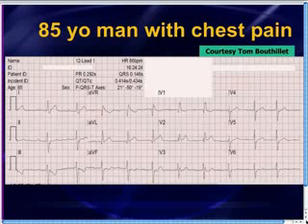Well, there is. Just like last week, there's a little Q wave and a big, wide R wave. And in V2, you've got the rabbit ears, the RS, R prime type of pattern. So this patient does have a right bundle branch block pattern.